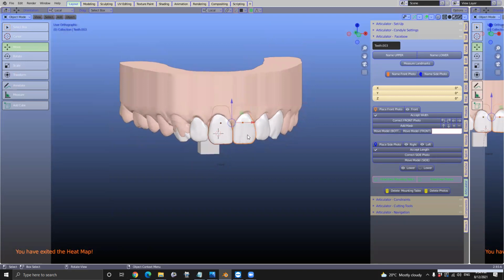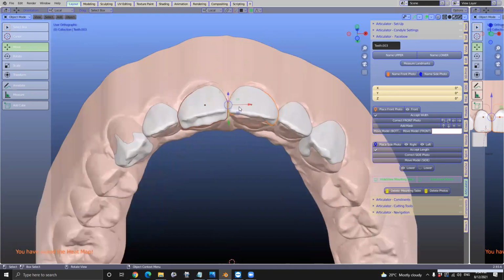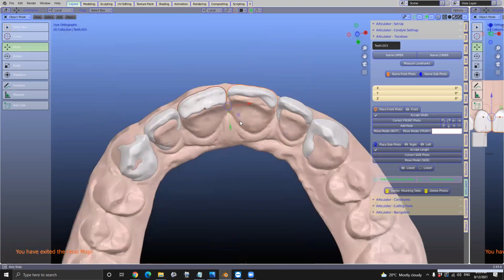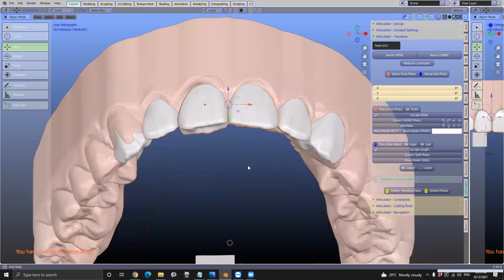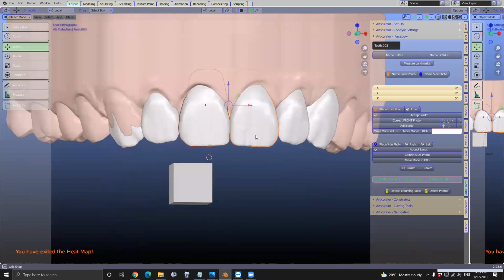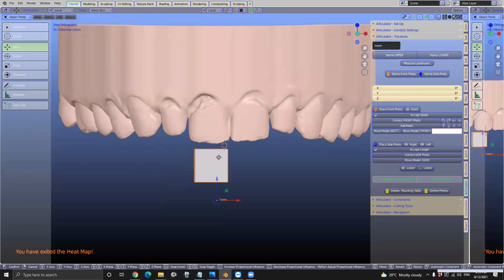Adjust the teeth before the wax up. So if one of the teeth is quite prominently leaning buccally forward, do we have the ability digitally just to trim it back a little bit? Oh, you're talking about, okay, I understand. So you've got these teeth. Let's just hide them before you even start. That's right, what we are doing, we are using the additive technique, isn't it? Yes. But what happens if we want to subtract a little bit?